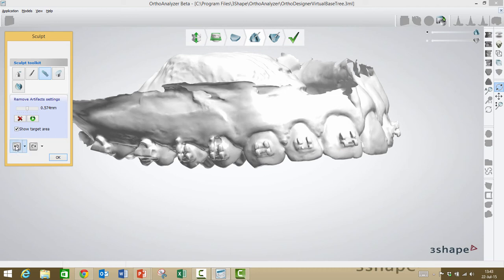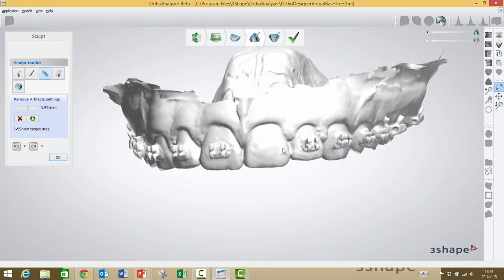Okay. So what do you recommend? I recommend 1 to 3 brackets at a time, so you don't have to do the whole procedure again if you debonded it at one time.